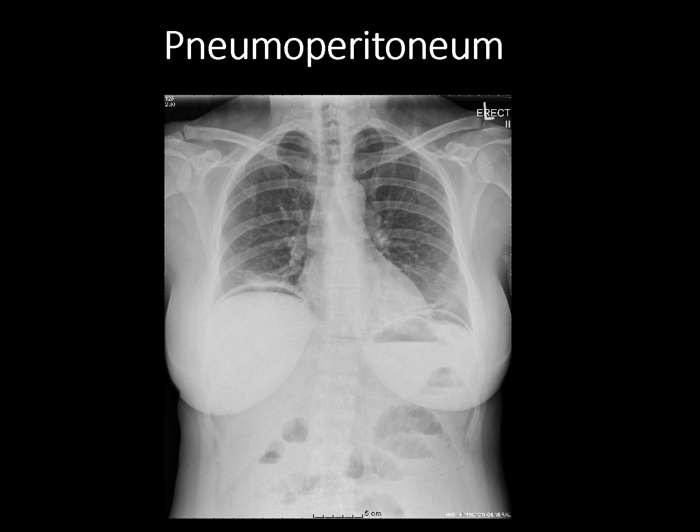So what does a pneumoperitoneum look like on a radiograph? Well, like we said on other videos, the most sensitive projection to pick up pneumoperitoneum will be your upright chest radiograph. And again, it goes back to basic principles, and I keep belaboring this point, where you want to be orthogonal to gravity in order to see an interface between layering structures of different densities. So in this case, we're looking for air versus soft tissue or fluid within the abdomen, and we want to catch that interface. So air will float antidependently against gravity, and fluid and soft tissues will be located dependently with gravity.